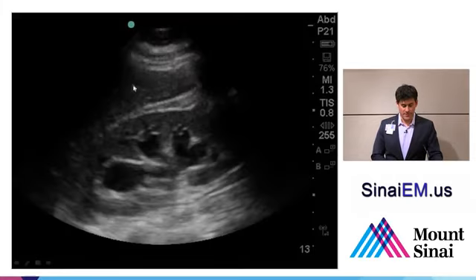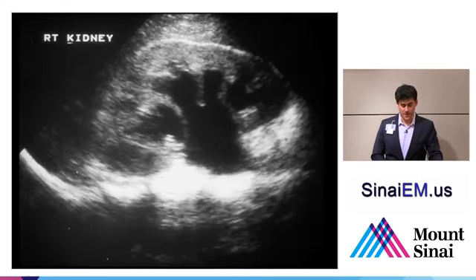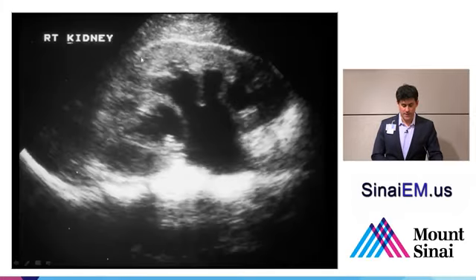So here we see liver and kidney, as we've seen several slides in the past. We've got the cortex around the outside here and the medulla in the center, and the inner medulla architecture has been obliterated and spread apart here by this dilated collecting system, all this anechoic space in the center here. We see on a transverse view as well that the central collecting system has significantly dilated and pushed out the rest of the renal architecture. Another example here, outer view of the kidney and the inner collecting system here at the renal pelvis extending up into the calyces, becoming very, very dilated.